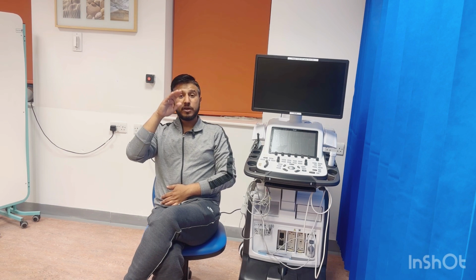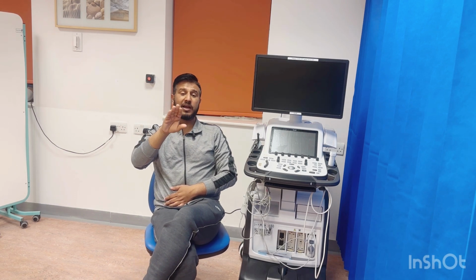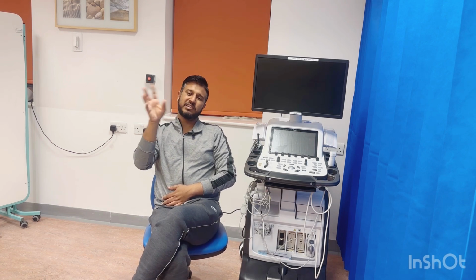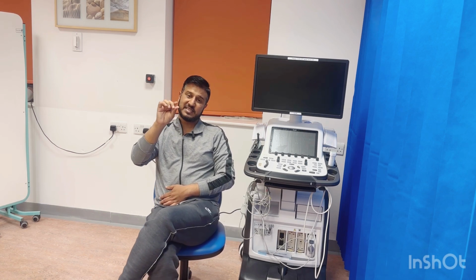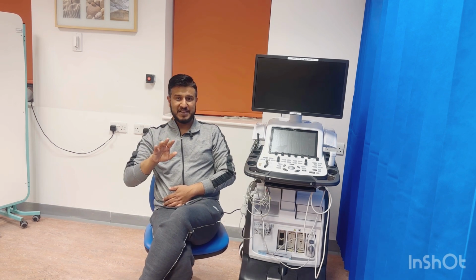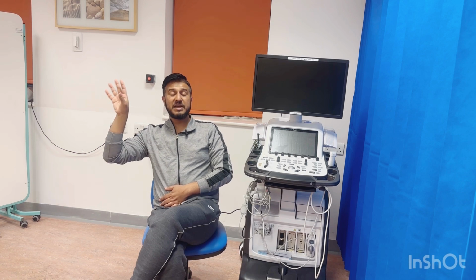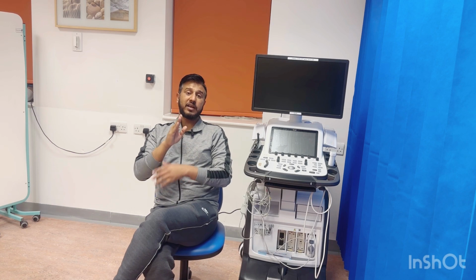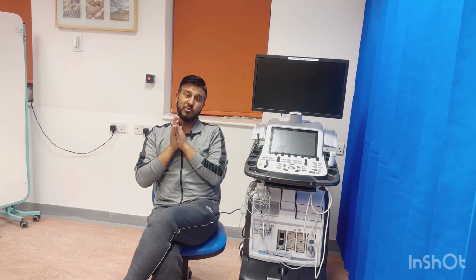You don't need to change your scale or your baseline. Your scale would be around 55 to 60, which is recommended. Usually the machines have 60 or 61 or 58, so you will measure it in the same scale, and don't decrease or increase the baseline. You are not going to do the PISA radius. Decreasing or increasing the baseline is related to PISA radius. So keep in mind, in vena contracta, you don't need to do anything with your baseline.